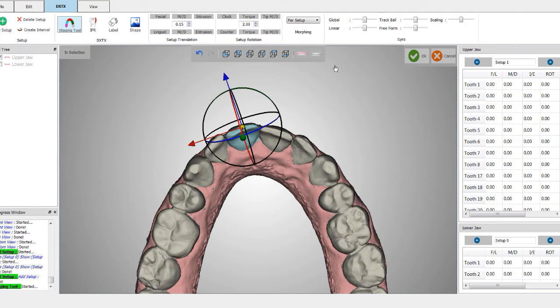The gyroscope is also customizable, so you can shrink or make any feature of the gyroscope disappear or appear however you would like.